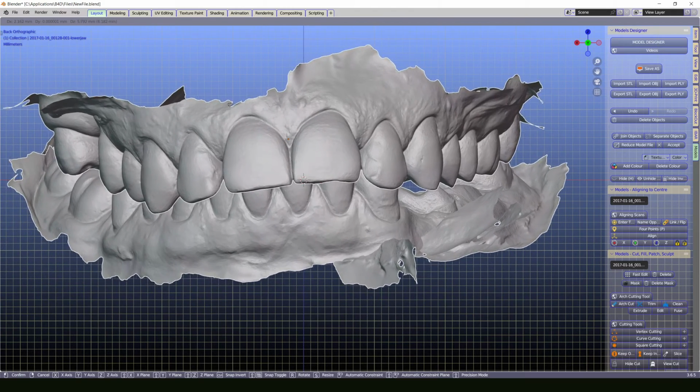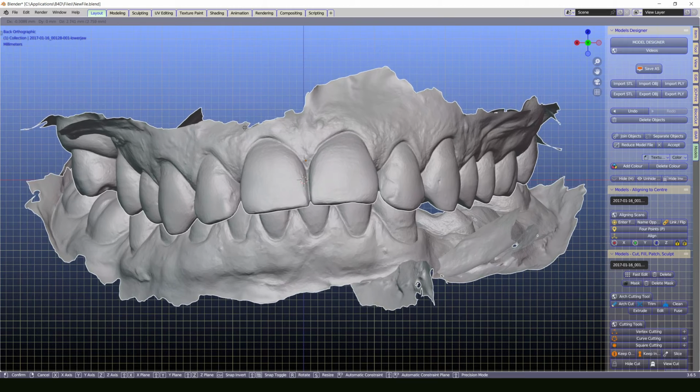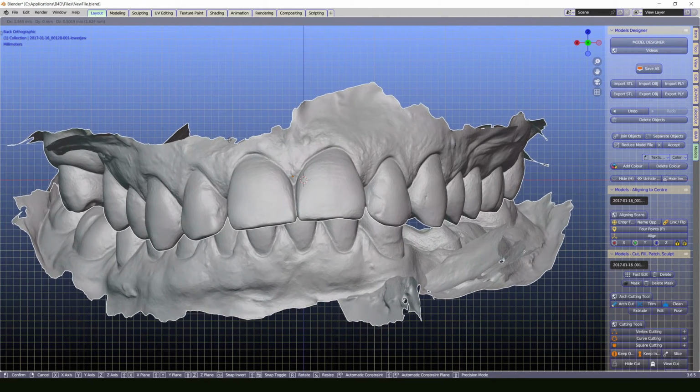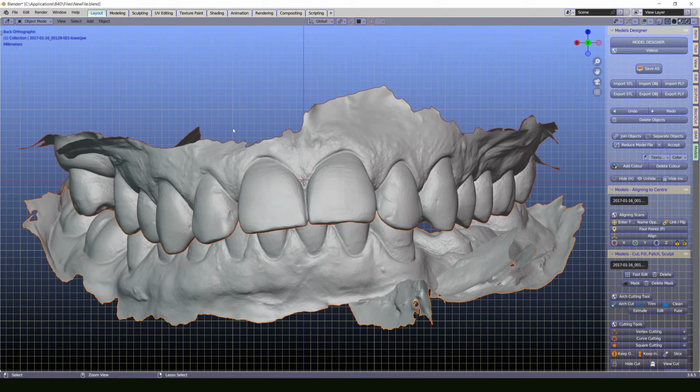So I would suggest you not overuse this function. For example, if you don't want to lose the original coordinates, then better click it. You see we changed the position, but then push the control button, Ctrl or Strg in German, with Z to bring it back to the original position.